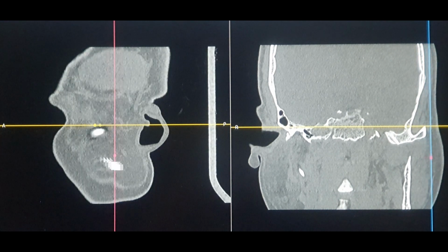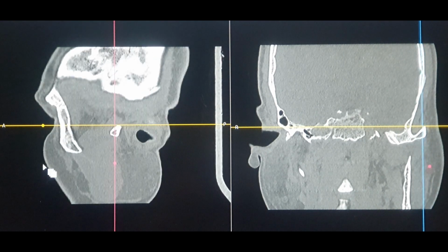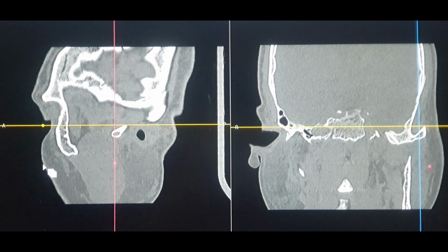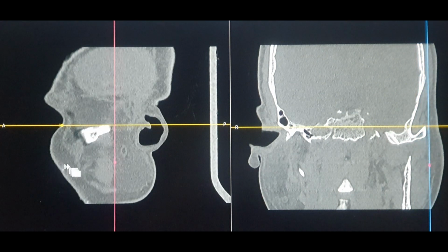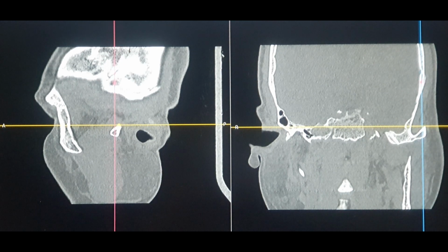So what you have to do is locate the auricle, that's the ear, the external ear, and it will look something like this, okay? So if you keep on going medially from the most lateral aspect, the first thing, the ear, is going to disappear, and after that you will be able to see the bone, that's the temporal bone. That's quite common sense because if you're going from the lateral to the medial aspect, that is from outside to inside, the ear will come first, right? And then the temporal bone.